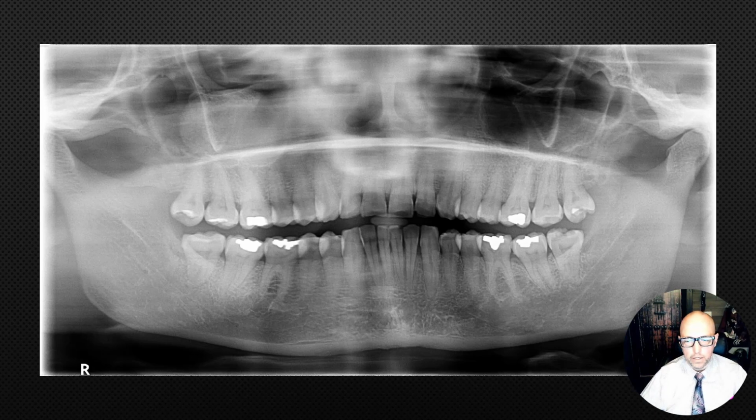All right, what do we see going on here? Look for your sinus borders. Look for all your anatomical structures again. Sinus borders intact. This one looks almost a little sclerotic, but if you compare with the entire pterygomaxillary fissure, it looks a little bit blurred. And what do we see going on here?